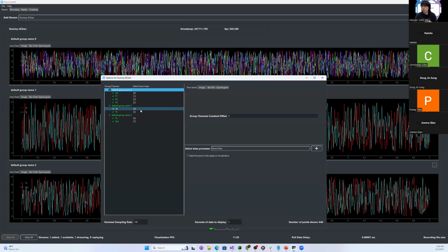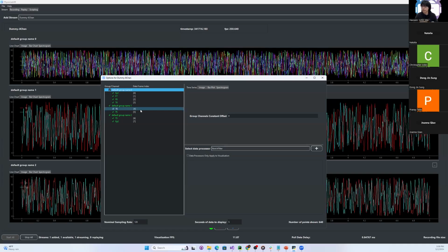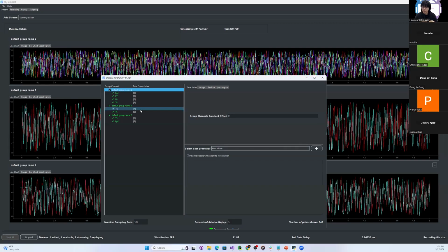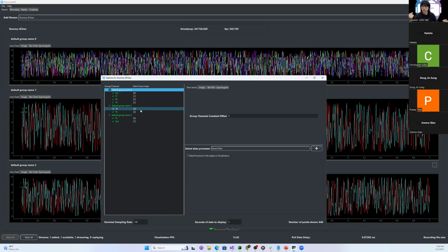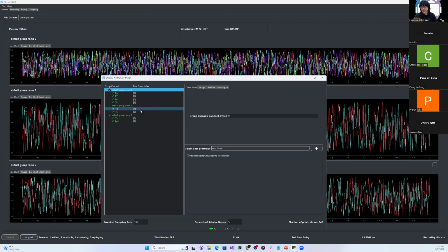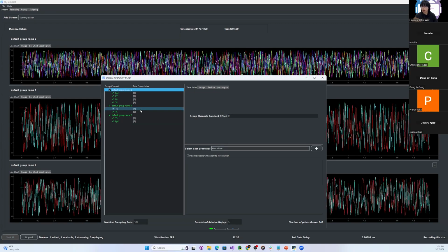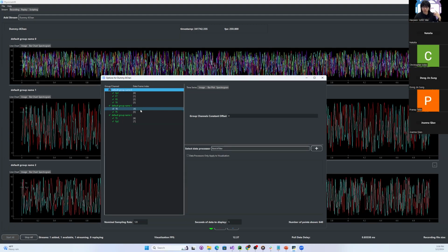In the real world scenario, one of the questions is why we need a filter. In the real world scenario, the EEG will be very noisy, and you're going to get noise from different sources. For example, you could have 60 hertz noise from your power source, and you could have noise from the participants' artifacts.